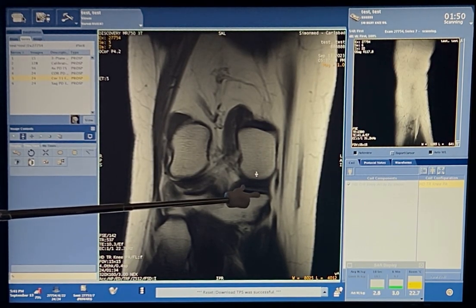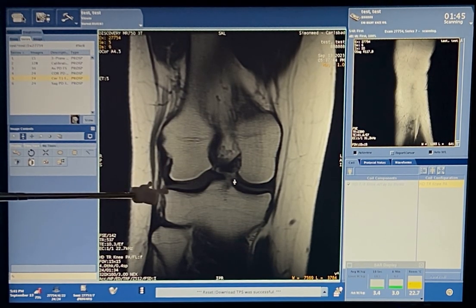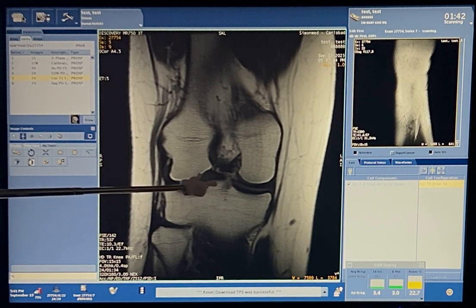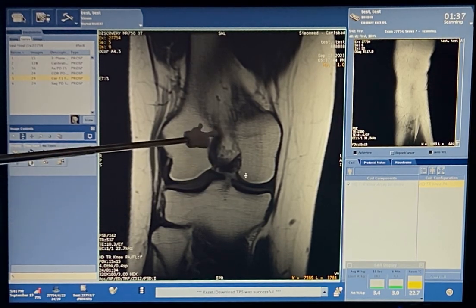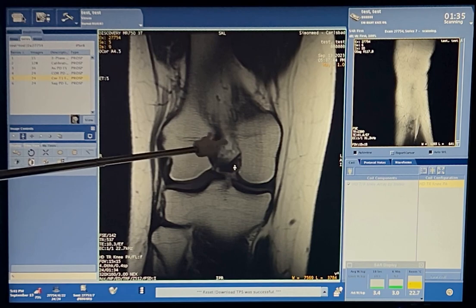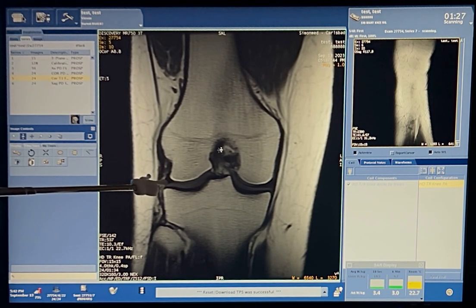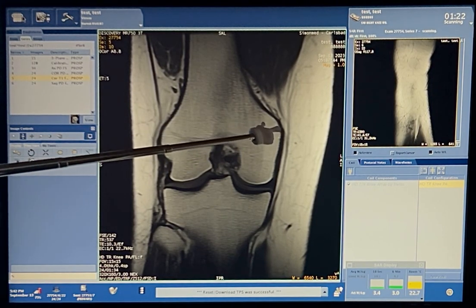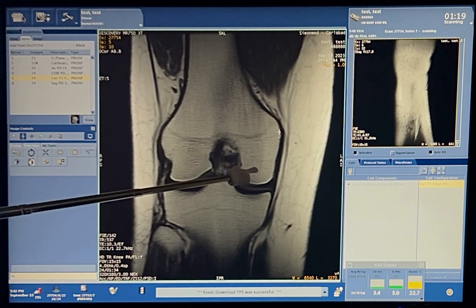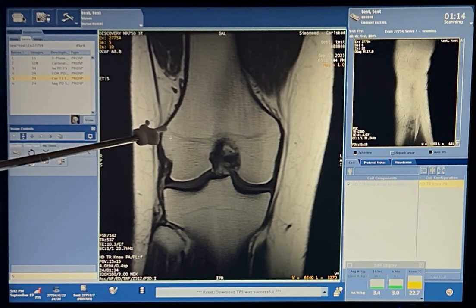Okay, keep going. You have the medial. Perfect, right there. Medial tibial plateau, lateral tibial plateau, intercondylar eminence, right here. And this right here, that gap in between the two condyles, is the intercondylar fossa. Keep scrolling. You have right here your lateral meniscus and medial meniscus. So medial condyle, lateral condyle, medial epicondyle, lateral epicondyle.